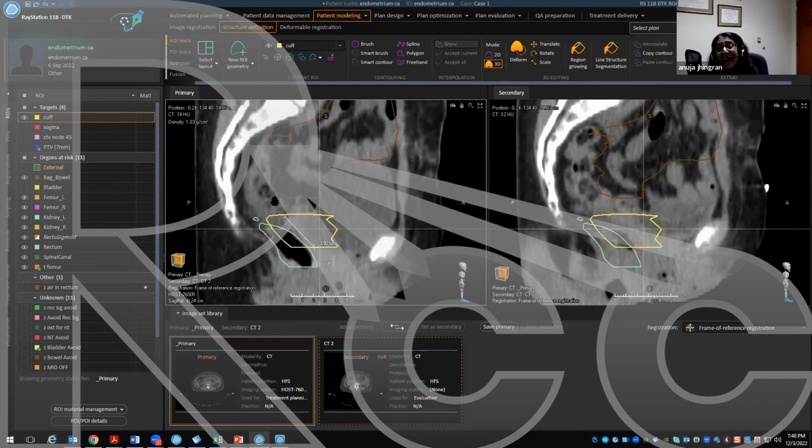All I'm supposed to do is show you the vagina in the post-op setting. So this is good, this is an easy thing. The cervix and endometrium are all the same. You treat about 4 cms. And if you looked, it is right at the mid-symphysis where you stop, and that's going to be right at 4 cms.